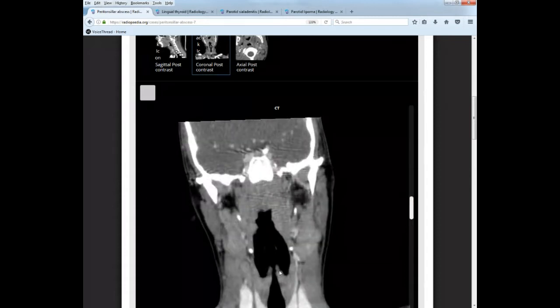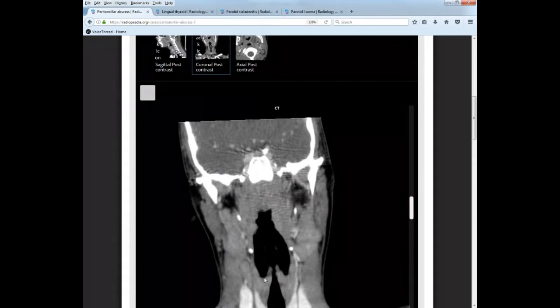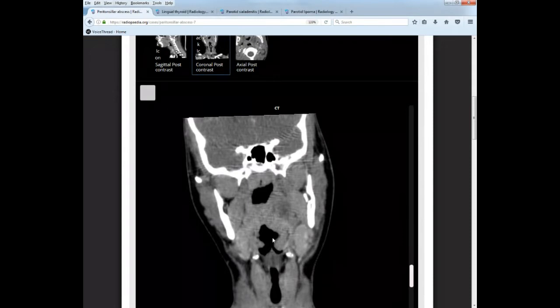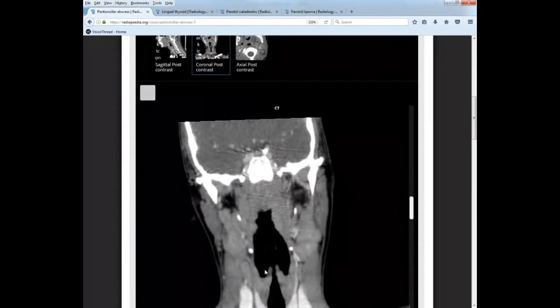So though that's in a coronal view, the other thing I want to point out to you is going to help you also find the cartilages in a different view when we talk about the cartilages of the neck. When you locate the piriform sinuses, which are pretty easy to see, I mean, they're these big, long pockets, there's really not anyone you're not going to be able to see them on. You might have difficulty seeing the vallecula here, but piriform sinuses you should have no problem seeing. So once you visualize the piriform sinus and you go like 1 or 2 slices posterior, you're going to see these two little folds, and that's the aryepiglottic fold, okay?